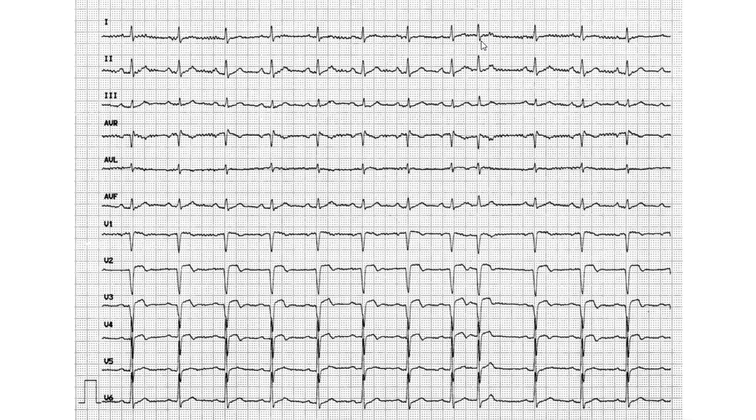Give me just a second to pull out the page. So you say that it is regular with a single extrasystole, and I think you should mark it as pathology, but you still call it regular with extrasystole. Otherwise, if there's more than one extrasystole, you would say irregular rhythm. That's the idea, and as you see, extrasystoles don't always look so alien. They can blend in very well. As you see here, it looks very normal. So that's an extrasystole.